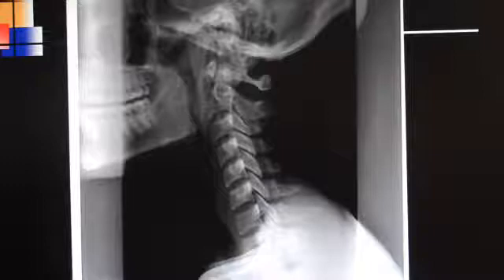And so we're going to just sort of start at the front of the film over in this area where the collimation line, of course, is right along right here. And so you see that the film has been collimated to this part right here. We do see, of course, the teeth, the lower teeth, and the teeth roots. We see the upper teeth, and of course we see the hard palate right along here. The maxillary sinus area, of course, is right here, and the eye orbit is up in this area.